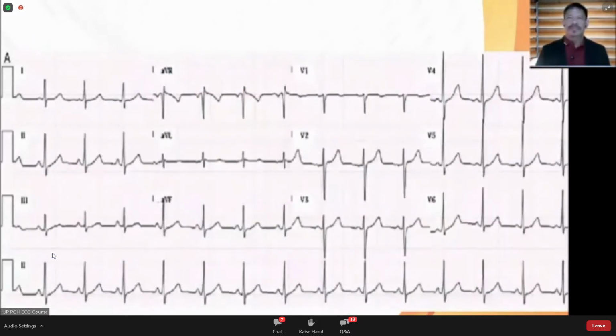Remembering how a normal ECG looks like is very helpful. The rate is not fast or slow. There's constant PP and RR interval pointing to regular rhythm. P is upright at lead 2 and also in 1 and aVF, where QRS waves are also upright, indicating normal axis. There is no aberration on PQRST morphology, interval, and relationships. ST is not deviated from isoelectric baseline, and there's good R-wave progression in the chest leads. If the ECG doesn't look like this, then we have to closely scrutinize the tracing.